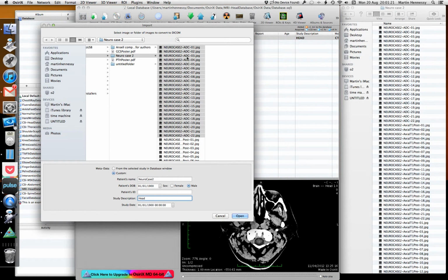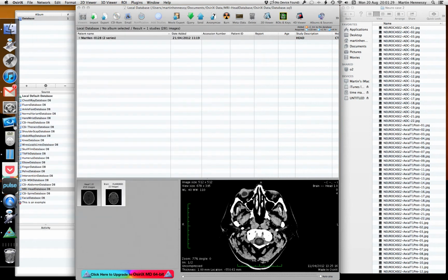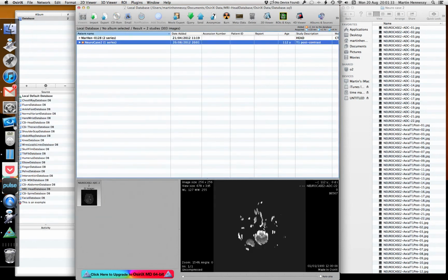So the important thing is that you've got the series within the actual name there, which we'll find out why just shortly. So anyway, open that. And because these are just JPEGs rather than DICOMs, they actually copy in extremely quickly.